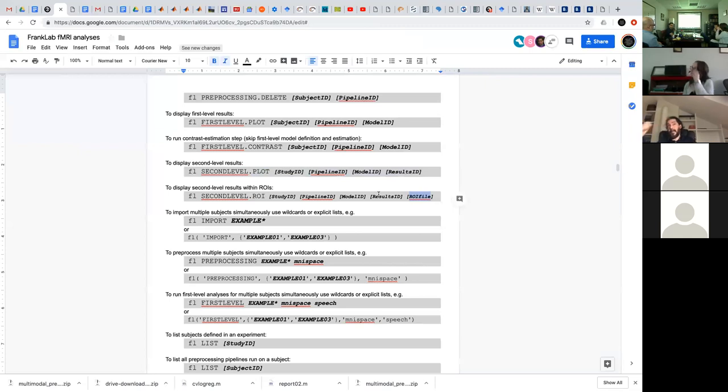In terms of the surface level analysis, we looked at this some time ago, and we decided that using a single file at the surface level in FS average space is almost exactly the same as using these subject-specific files in the original space of the data. Well, unless you've corrected the ROIs for each individual subject. Right.